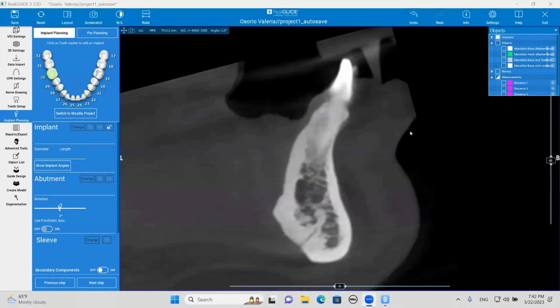So in the first case we talked about today, I was worried about hitting the submental artery back in the molar region and having a sublingual hematoma. You would not have that problem here as long as you stay within the confines of the bone. All you would do to stop the bleeding would be to either place the implant, place a drill, or place a direction indicator, anything that would allow the body to clot it off.